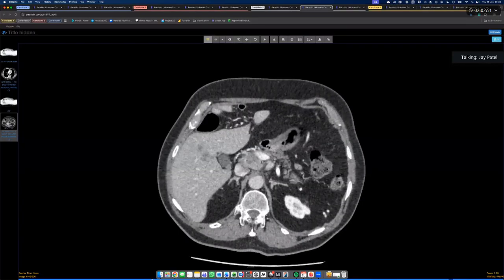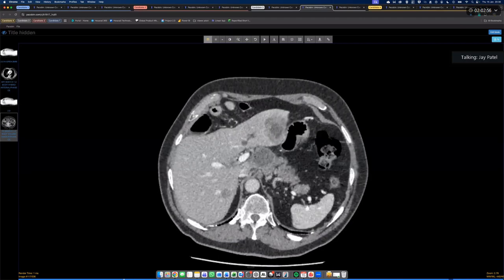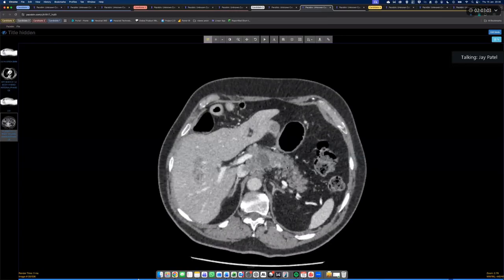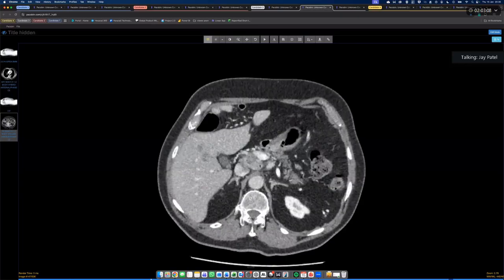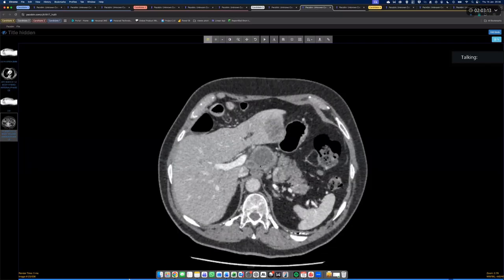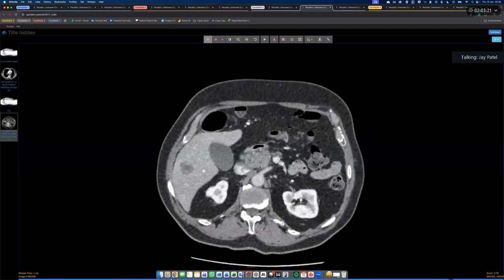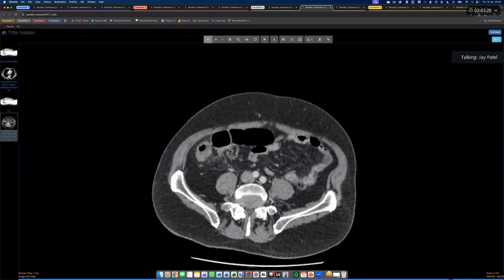If this was a pancreatic tumor, it's big, but look, the portal vein is narrowed, but it's still patent. The pancreatic duct is not dilated. And so you were right in not calling this pancreas. This is just big old peripancreatic, periportal lymphadenopathy, necrotic. That distribution made you think about colorectal, and I think that's very sensible. So this is where it became a bit challenging.